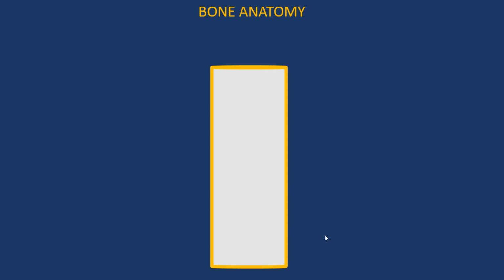Oftentimes, we're going to investigate rib stress fractures with radiography first, and then ancillary imaging such as CT, MR, or ultrasound second. So it's really important we appreciate what we are and are not looking at in the interpretation of a suspected rib stress fracture. In particular, we want to make sure we're not overcalling a rib fracture when we should be considering other more sinister patterns of bone disease. Understanding patterns of periosteal reaction can help us not fall into this trap.